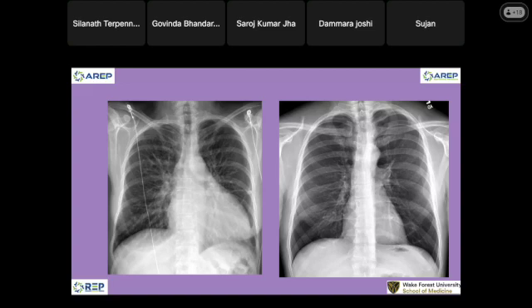But the cause, you gotta go find it. I don't know what it is. So the heart is big, very big. This is cardiomegaly. When you see a big heart, it could be just the heart is really, really dilated. The chambers are really, really dilated. Or the patient may have pericardial effusion. Normally pericardial effusion will look like a flask-like shape. This one doesn't look like pericardial effusion. If there is any, it's going to be very little.